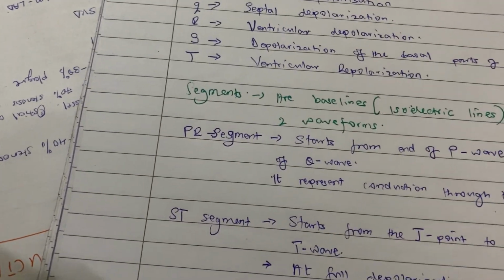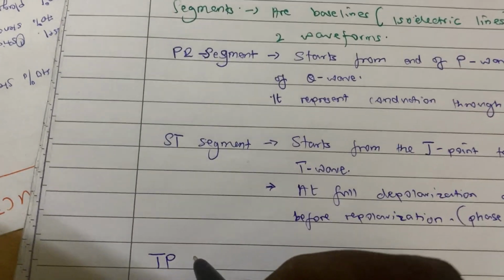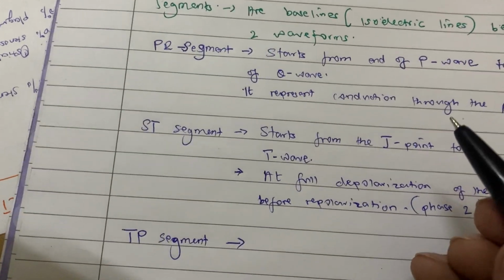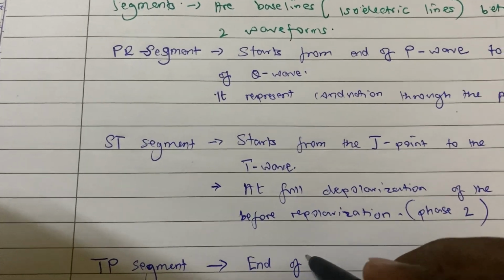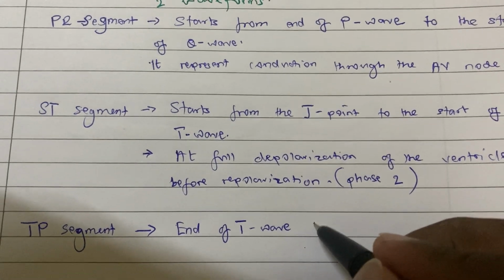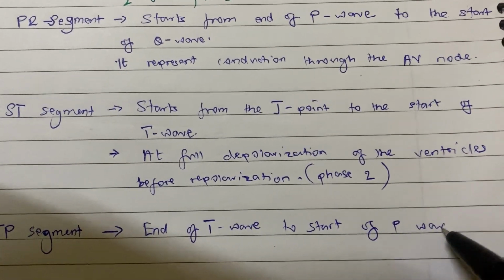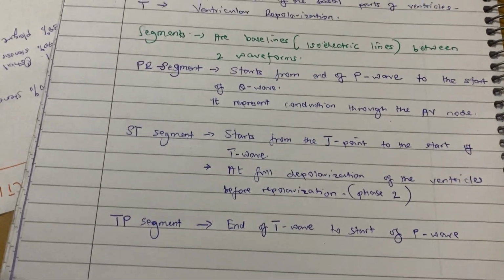And then another one is the TP segment. TP segment is what? End of T wave to the start of P wave.